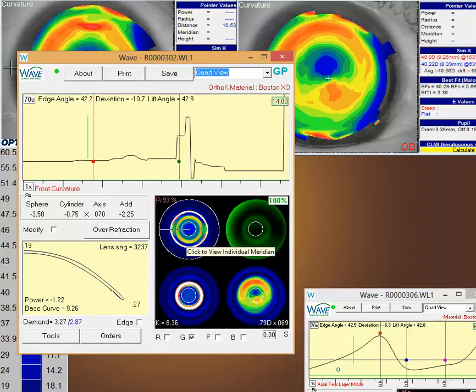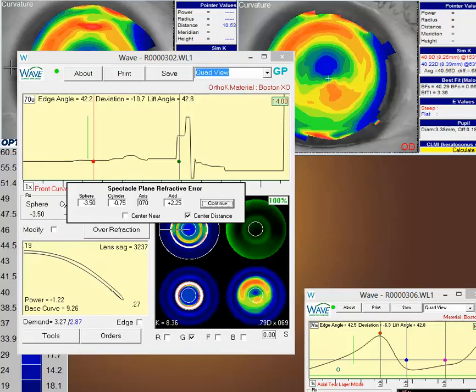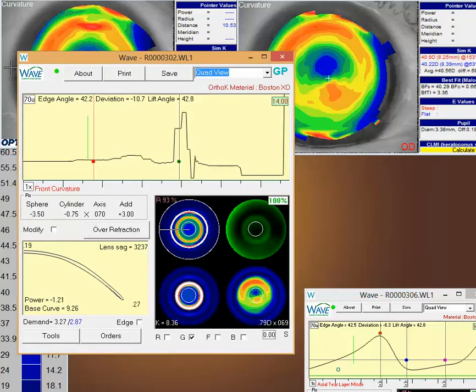Sometimes you almost have to go to a near center, almost like an Air Optix multifocal soft lens. But in this case, if you're getting okay vision, what you could do is increase the add a little bit right here. Usually I go a little bit more than the normal add, maybe a half to three-quarters, even more sometimes. Maybe bump this up to closer to 2.75 or 3. And then maybe even move this in to a smaller distance zone, increase that bifocal size a little bit more, and at least that will give the lens a better fighting chance.